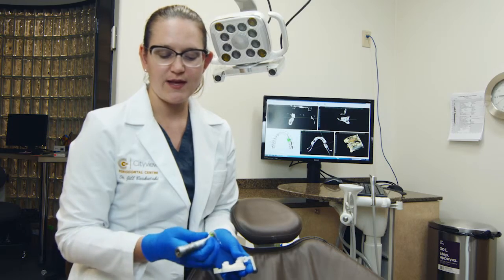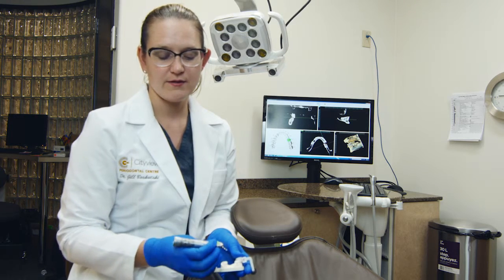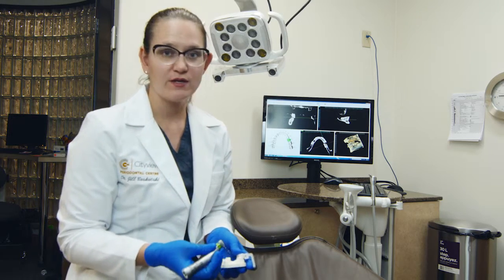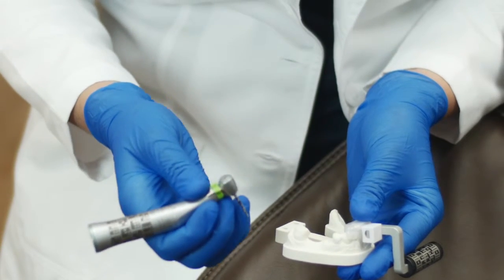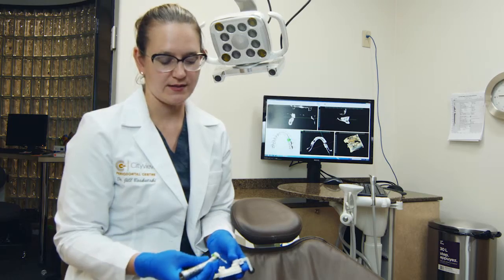The other thing I like about the handpiece is the only change to the handpiece is there are these little markers on it that are captured by the overhead camera, but they really don't interfere with either the weighting of the handpiece, sterilization of the handpiece, or anything else. It really is just a normal everyday implant handpiece.